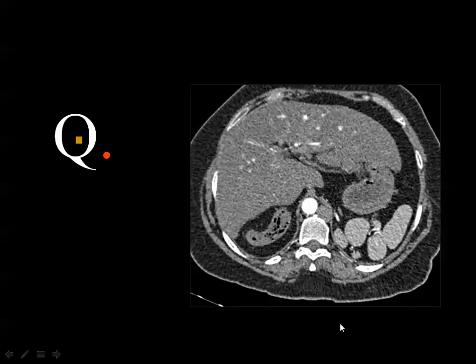Yes, polysplenia, and you see this is an arterial phase of a contrast enhanced CT scan of the abdomen without oral administration of contrast media. Only you see here that the stomach is on the left side, that the liver is on the right side. There is no situs ambiguous, but the site of the spleen is occupied by multiple spleens. And whenever you are going to diagnose polysplenia, you should look for the IVC. This is very, very important.